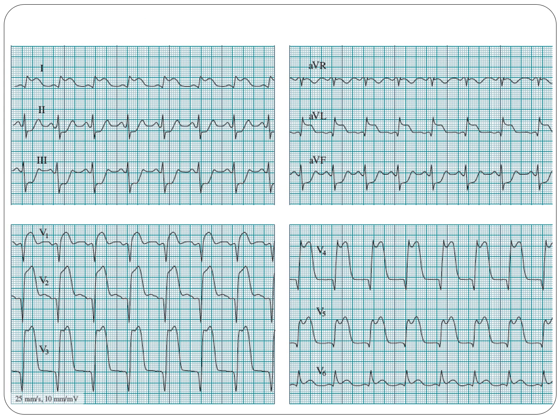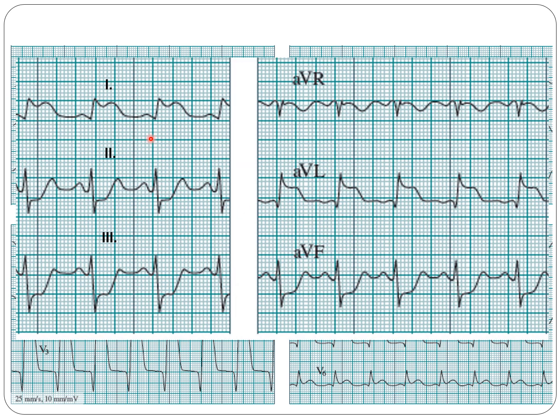The next ECG, it's the heart rate, it's rhythmic. The heart rate is close to 100, about 96 or 95. We do have P wave, and this is sinus P wave. PR interval is normal. The width of the QRS is normal.